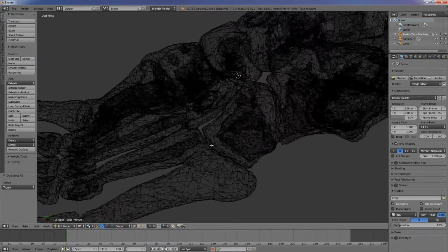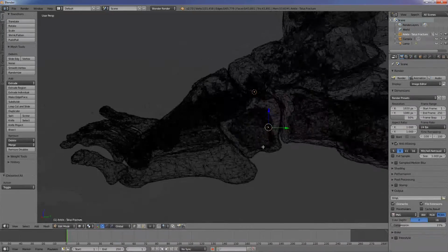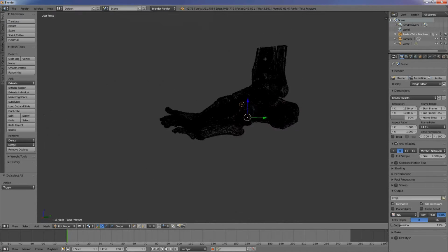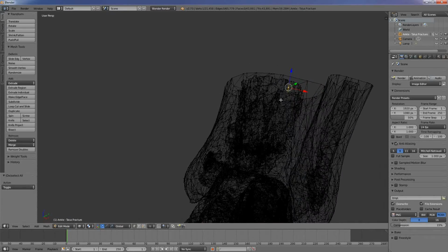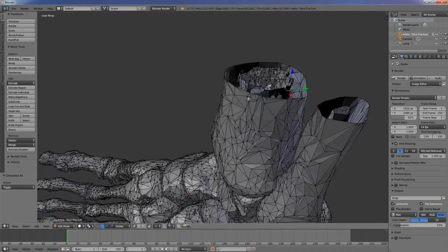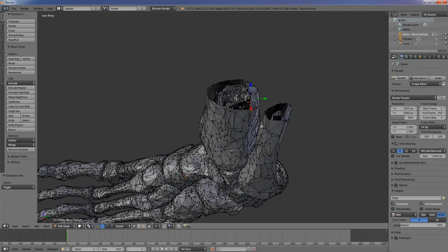And you can see that there's a lot of extraneous mesh all throughout the bones. For example, in this metatarsal, there's mesh from a medullary cavity. All of these bones have internal mesh components that we don't necessarily want for our final 3D printed model. Also, at the top of the mesh, where the tibia and fibula are cut off, we can see that there are open gaps that we need to deal with.